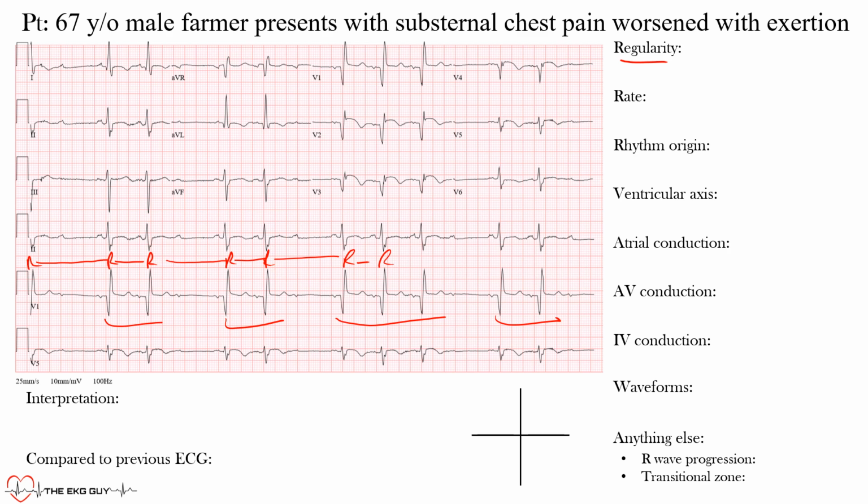Okay, but there are some other waves that are occurring more regularly, and those are the P waves. Okay, and the P waves are these here. Here's a P wave, here's another one. Okay, a P wave here, here, here. And if you were to measure these out, these would be all P waves. Okay, so from one P wave to the next, this is what we call our P to P interval. Okay, and throughout all of these, the P to P intervals are the same.